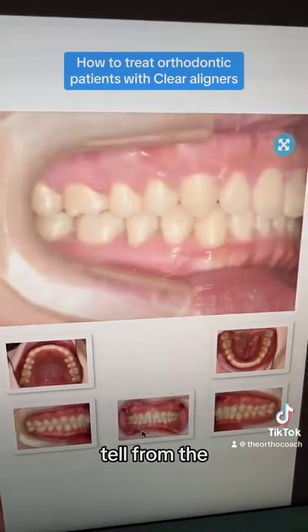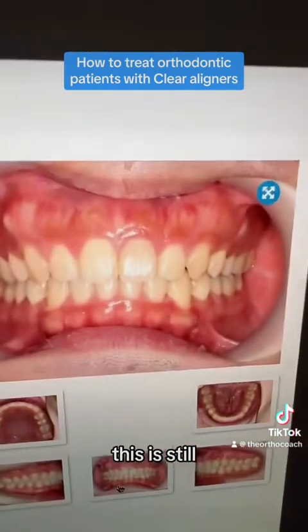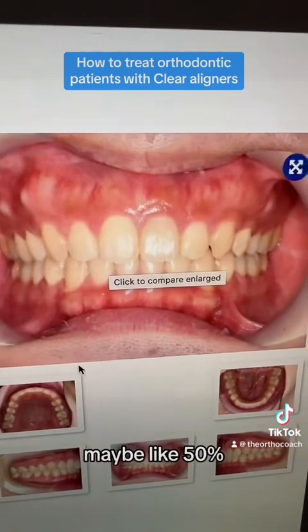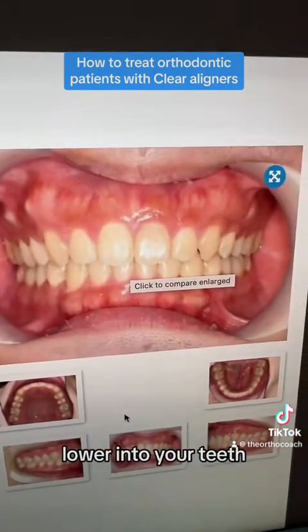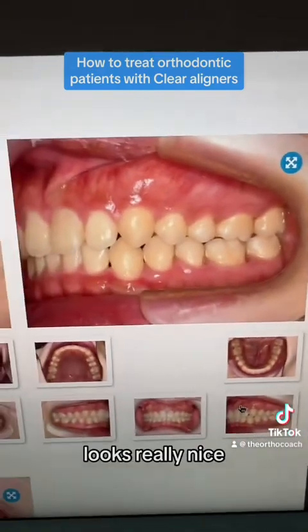You can really tell from the front view. This looks really nice compared to that. This is still just a little bit of a deep bite. It's nothing to worry about. I think it's maybe like 50%. I think I would go just maybe 10 more percent to see a little bit more of these lower anterior teeth, but it's pretty good. I like it. It looks really nice, and the lateral view, the side view, looks really nice too.